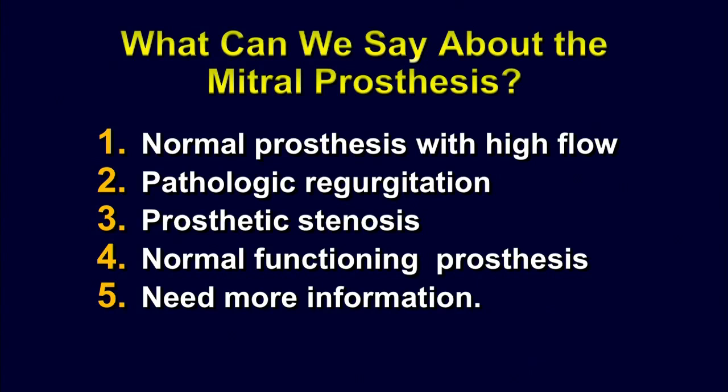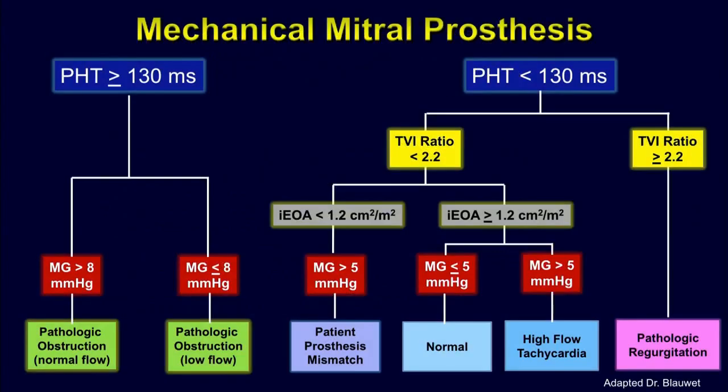Is this a normal prosthesis? Is there regurgitation or stenosis? Is this a normal functioning prosthesis, or do we need more information? And so when we take a look at this valve, we can see, let's go to these algorithms.